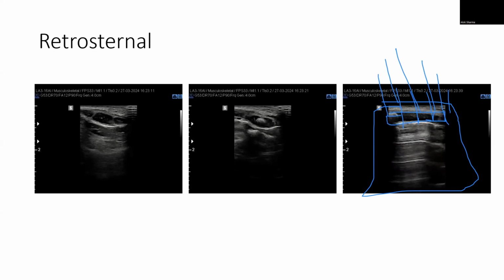You can get confused that near the medial ends of the sternum, there is evidence of a pneumothorax. There might not be. So my only suggestion would be that by definition, and from what I've been taught, we never ever look through the sternum to try and make a diagnosis of air in the anterior mediastinal space. The only way to make that diagnosis is by doing a lateral view on the X-ray.